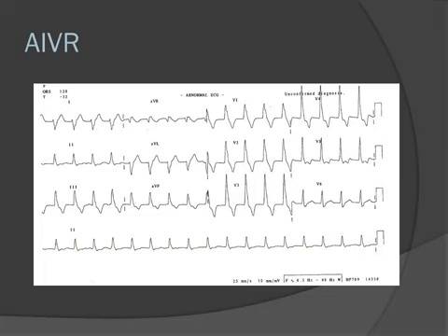This is a very common rhythm in patients who have reperfused an acute myocardial infarction. Classically occurs when you thrombolize a patient and they go into AIVR when they reperfuse. Also occurs in PTCA when the cardiologist balloons a lesion. This is not usually a dangerous rhythm. This is usually a good sign that there's been reperfusion of the ischemic ventricle.